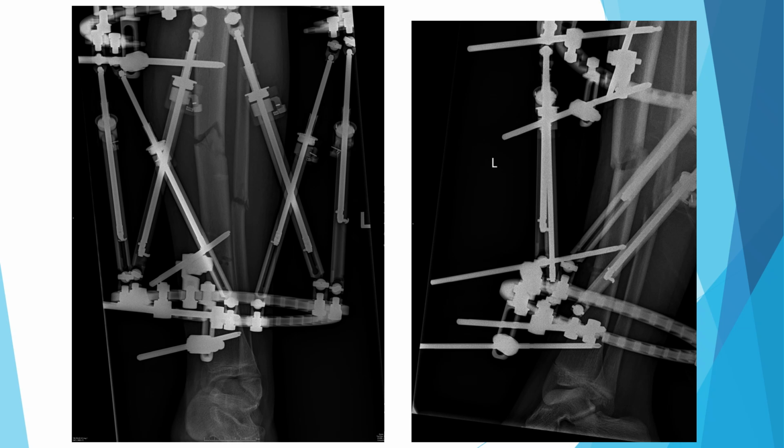Of course, maybe you can use this one. You have here the 12. I know now you're expert. You know how to put the points to do the frame matching. Of course, the tech did a good job, so he got the lateral of the tibia. Not a very good lateral, but at least there is some lateral of the tibia. But we are interested to see the frame so that we can do the program.